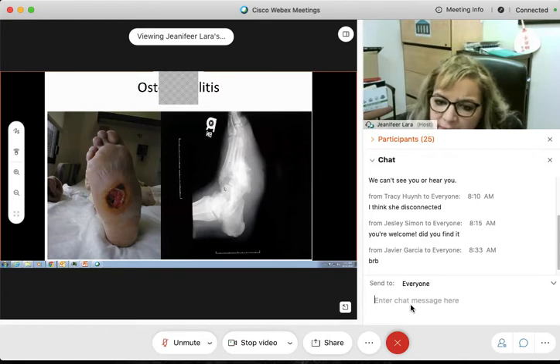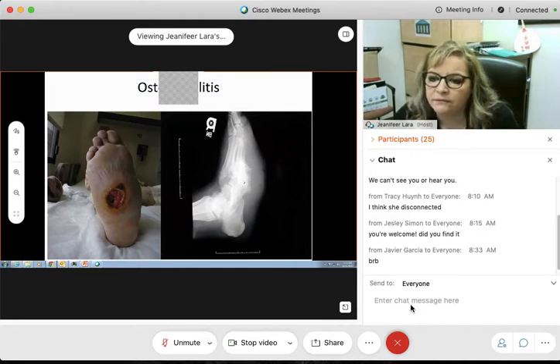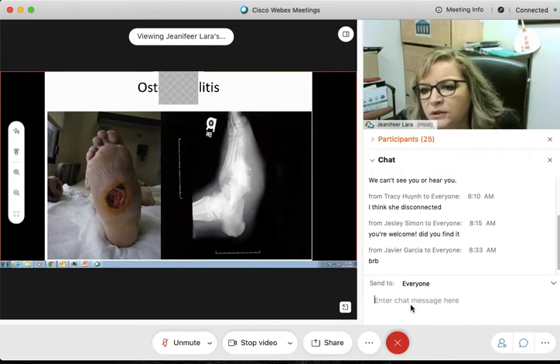So as you can see, when you get into the lower extremities, you'll see that this does not look like a normal bone or a lateral foot. You're going to see that there are some types of changes. Does everyone see that roundness and that brightness? Well, when you start to see brightness, what is the radiograph indicating? It's absorbing x-rays, right?